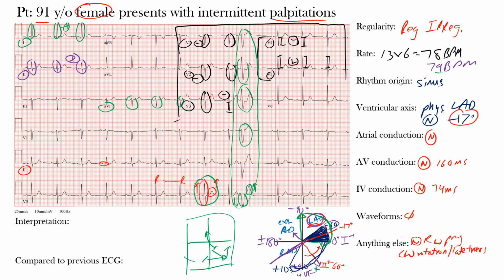Okay, now in terms of the P wave to QRS ratio, there's often none unless you have that retrograde P wave conduction present. Okay, there's no PR interval because there's no P wave. The QRS interval we said is prolonged, so greater than 110 milliseconds, or at least sometimes some will consider that 120 milliseconds, as we see here, and that abnormal QRS morphology. Okay, notice that the QRS complexes have a different morphology. Okay, these complexes here have a different morphology than those that surround them. Okay, so that's one thing to know. There tends to be no grouping or dropped beats present.